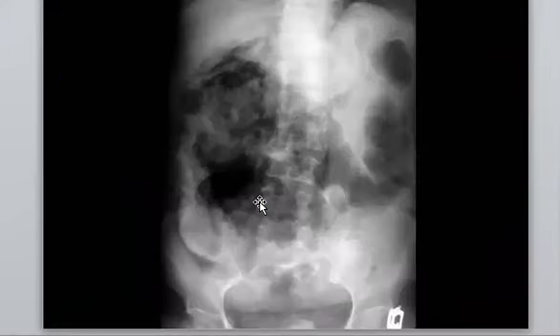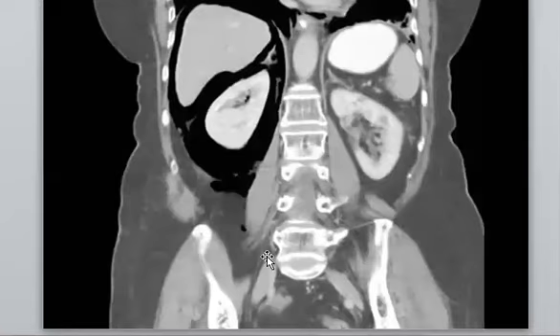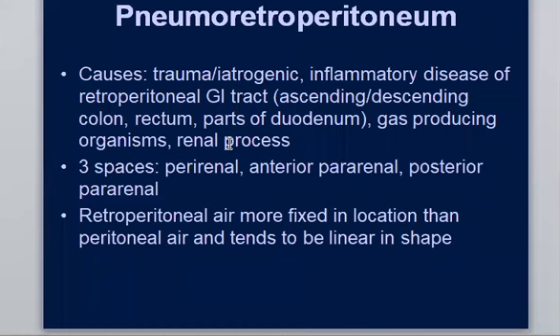So another case, which is a bit easier one, maybe short case. Yeah, pneumoperitoneum, free air in the abdomen, which is easier one. Yes, pneumoperitoneum, and in the CT, you can see clearly the air, so that's what's called pneumoretroperitoneum.